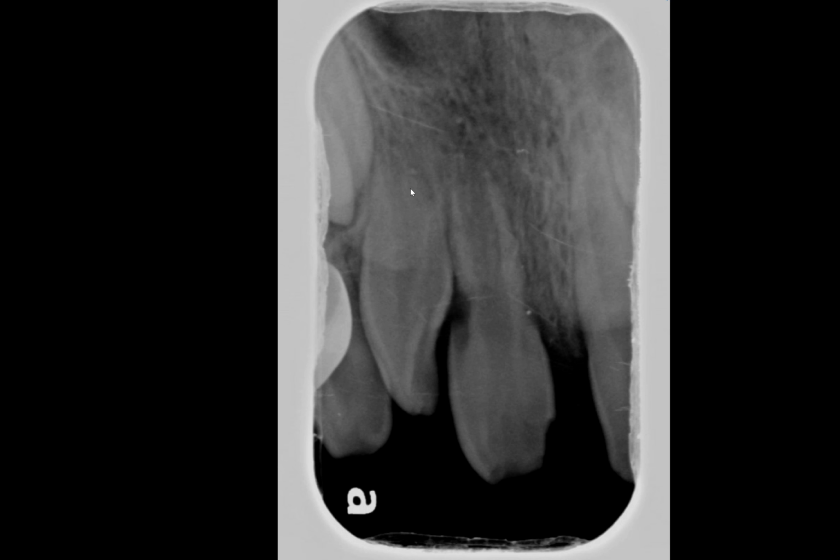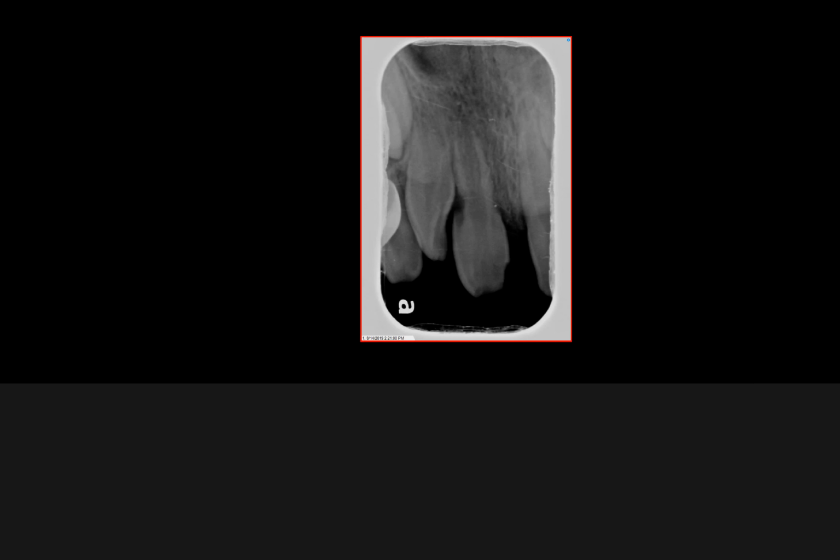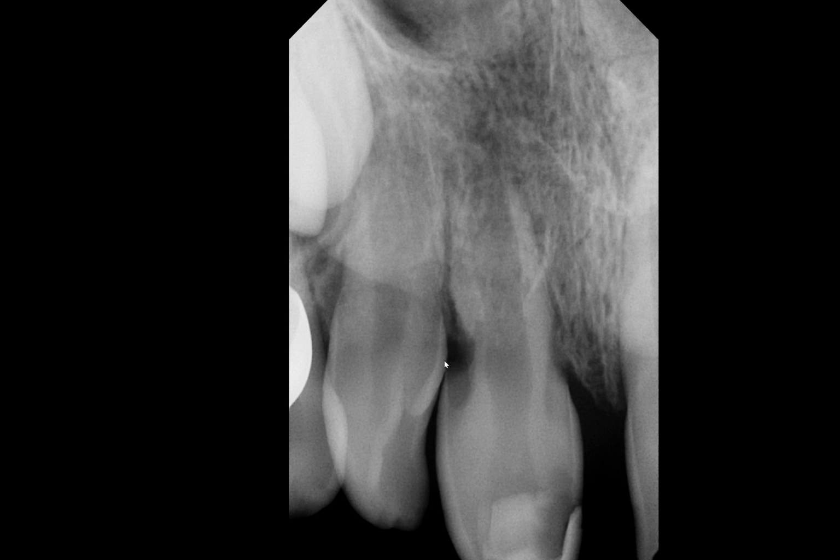Now, almost exactly a year after the trauma, we have the latest periapical radiograph taken. Here. Patient did receive some sort of restoration to repair the chipped incisor, but unfortunately there's decay underneath the margin of the restoration. Since the last radiograph, perhaps the cervical resorption has gotten even bigger, slightly bigger, and now it's even more prominent that the resorption is definitely seen on the mesial side as well.